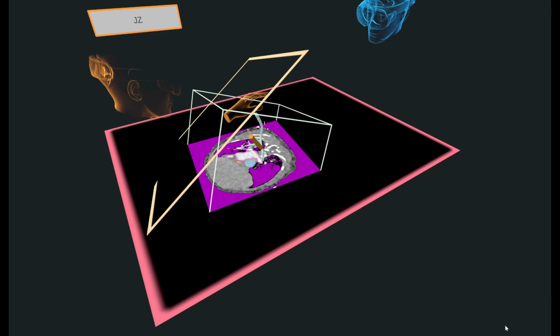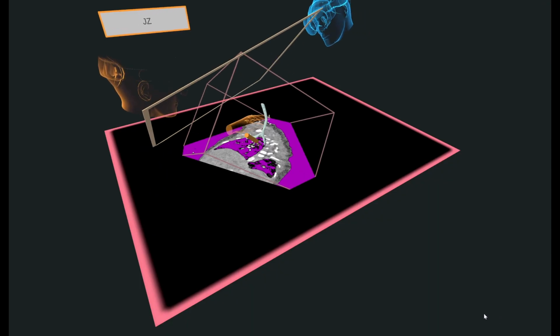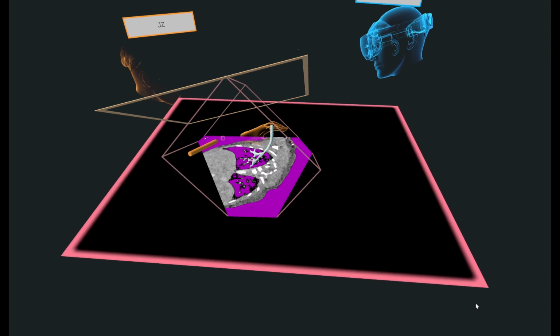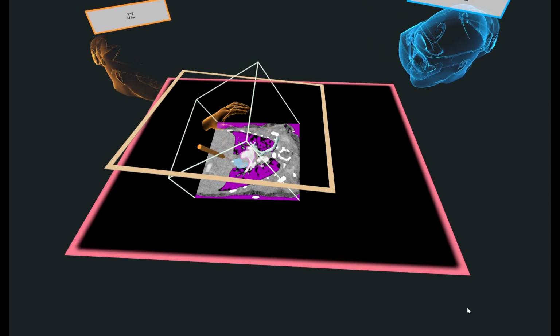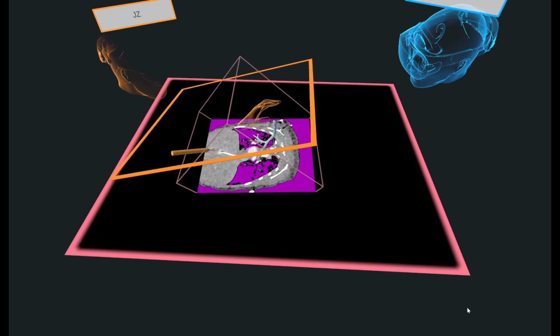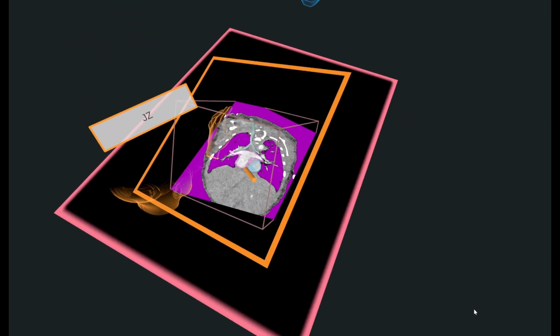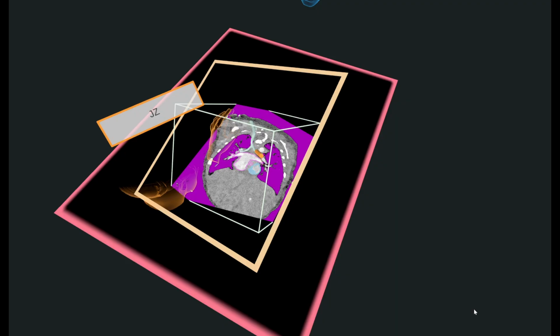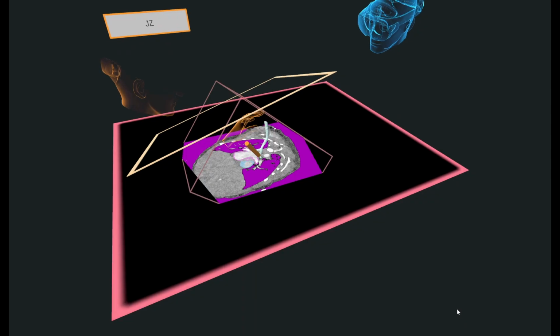So this is like segmenting the airway. We are changing our histogram to make sure that we're highlighting the areas that are black and full of air. I went to the more negative numbers so we can see everything is highlighted that it's air. I'm trying to determine if this airway has any compression, which is critical for patients with complex heart disease, including heterotaxy.